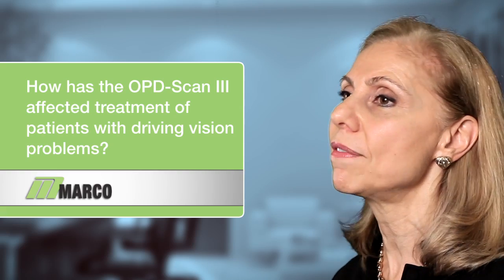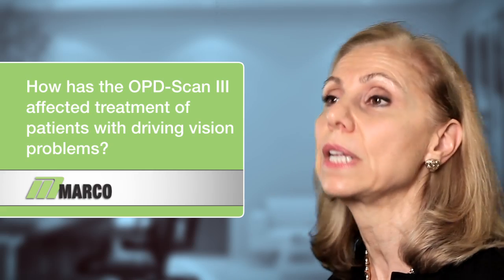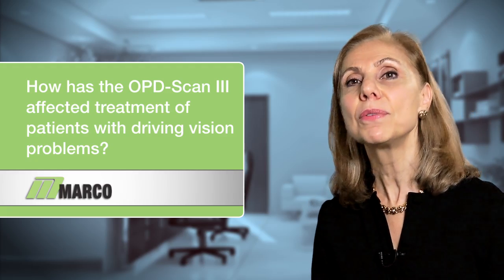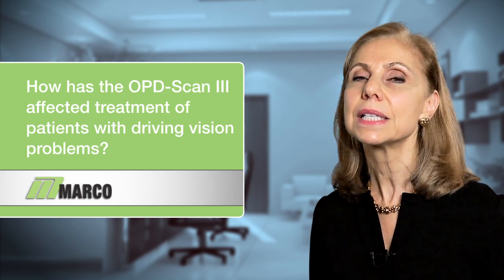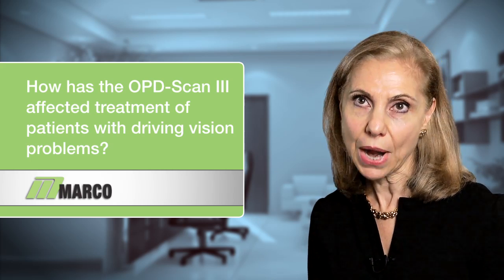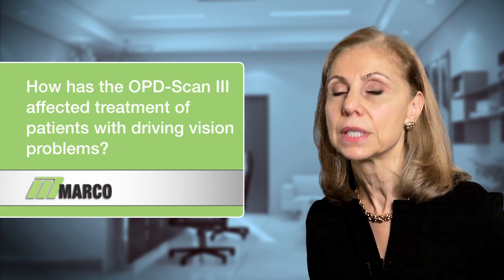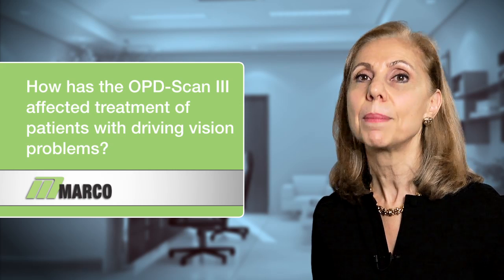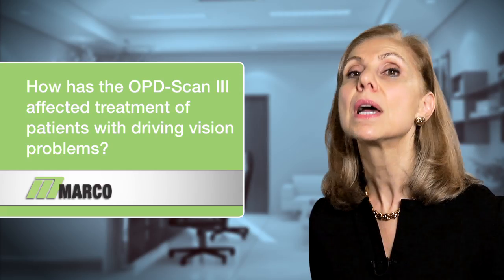And even with all of that, often we were unable to find a solution for these frustrated patients. Now with the OPD III, they have a feature of daytime and nighttime driving. This has been such a help to our practice, and particularly to this small subset of patients. What we are able to do now is refract them under mesopic and scotopic lighting conditions.